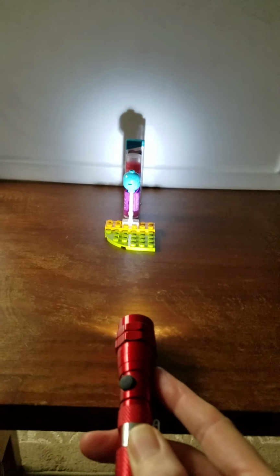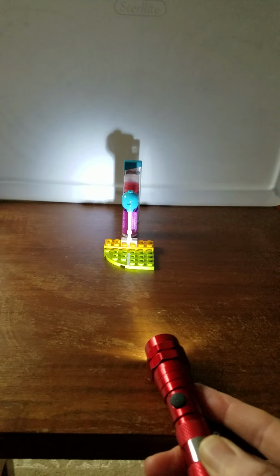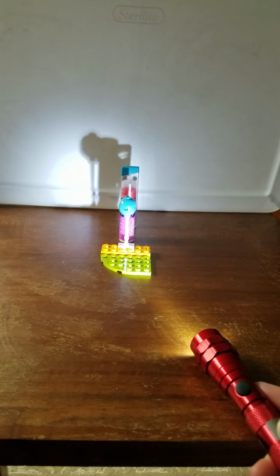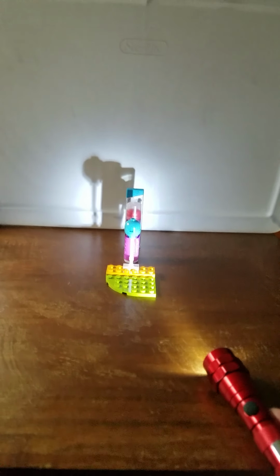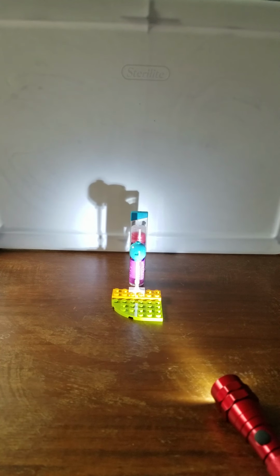Now, if I turn the direction of my beam to go more distal, what's jumping out in front and really shifting with the direction of my beam? The one that's shifting the most is the lollipop shape, that blue circle. You see how in the shadows in the back, that one has jumped out the most, moving distal with the direction of my beam, which is heading distal as well.